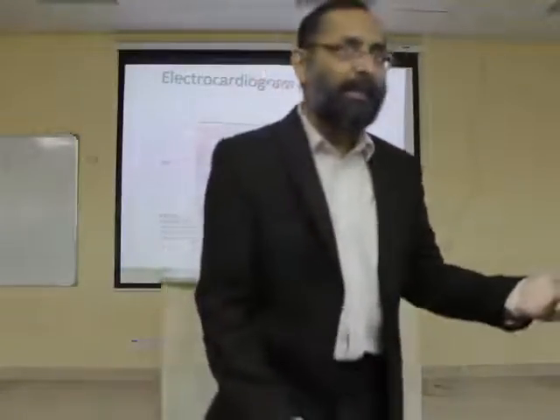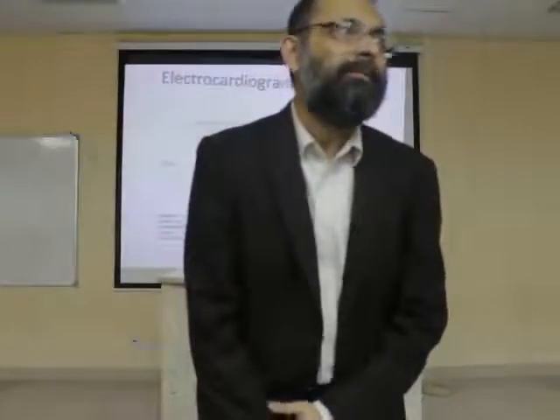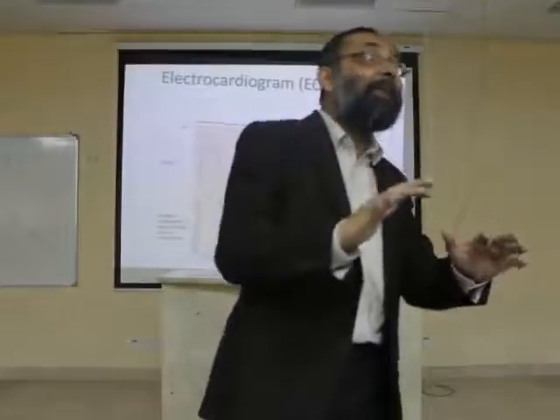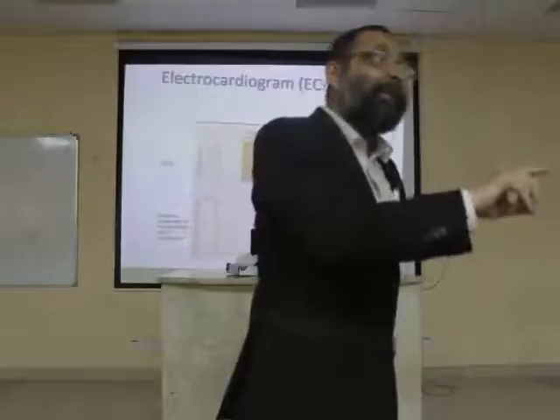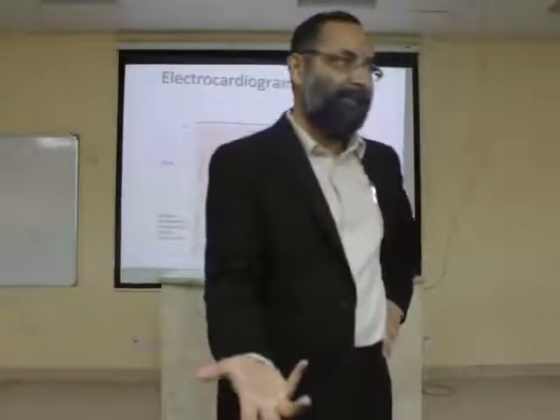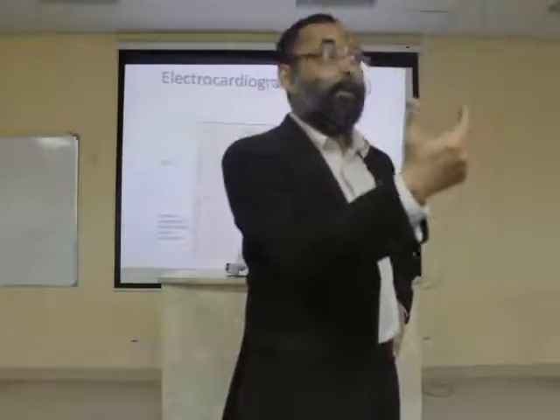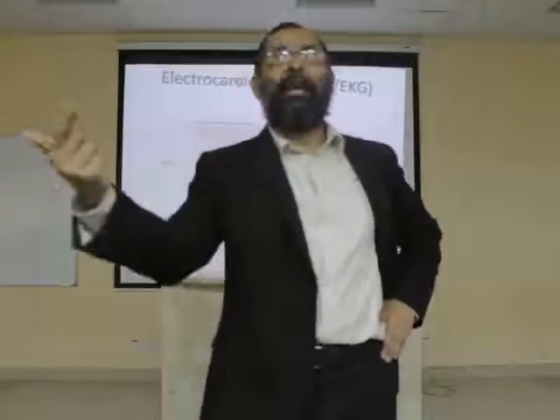You are including the P wave and you are including the PR segment. Can you make an interval? Yes. What will be the name of that interval? PQ or PR interval, same. But now you call it an interval. Now, can you differentiate between the PR segment and the PR interval? There is a big difference, isn't it? The PR segment is a straight line only, but the PR interval is the P wave plus the straight line, the segment.